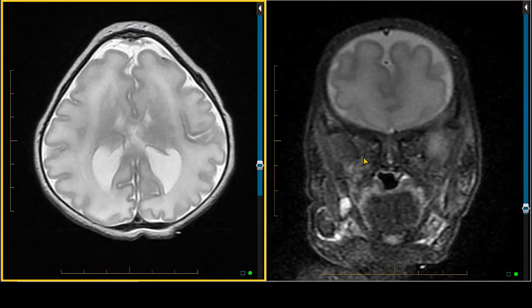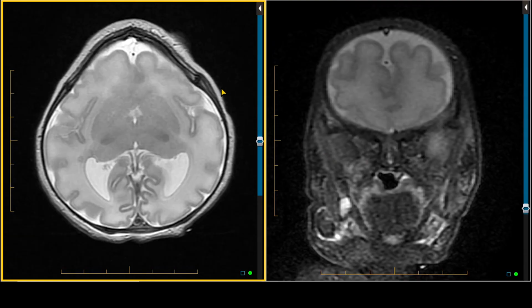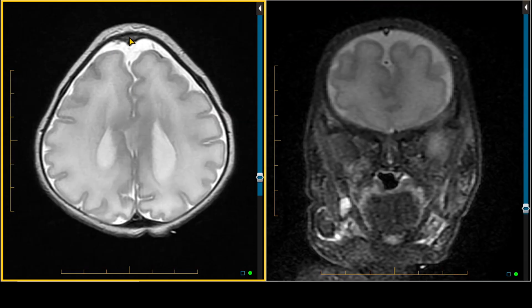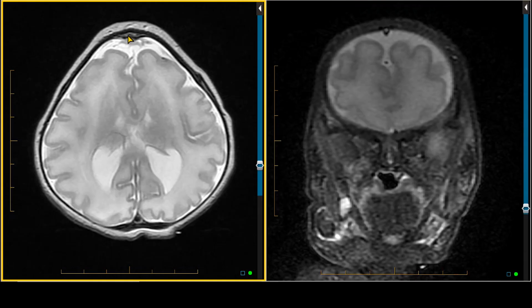This is an MRI of the brain in a newborn that had an abnormal fetal ultrasound. An axial T2 weighted image shows a couple of things. First of all, we see this anterior sloping of the frontal bones that goes up to the midline. And midline, well, we don't get a great view of bone on MR compared to CT. It looks like there's actually bone continuity between the two frontal bones, whereas at this young of an age, the metopic suture should be there. So this raises possibility of metopic suture craniosynostosis, which can result in a skull configuration known as trigonocephaly.